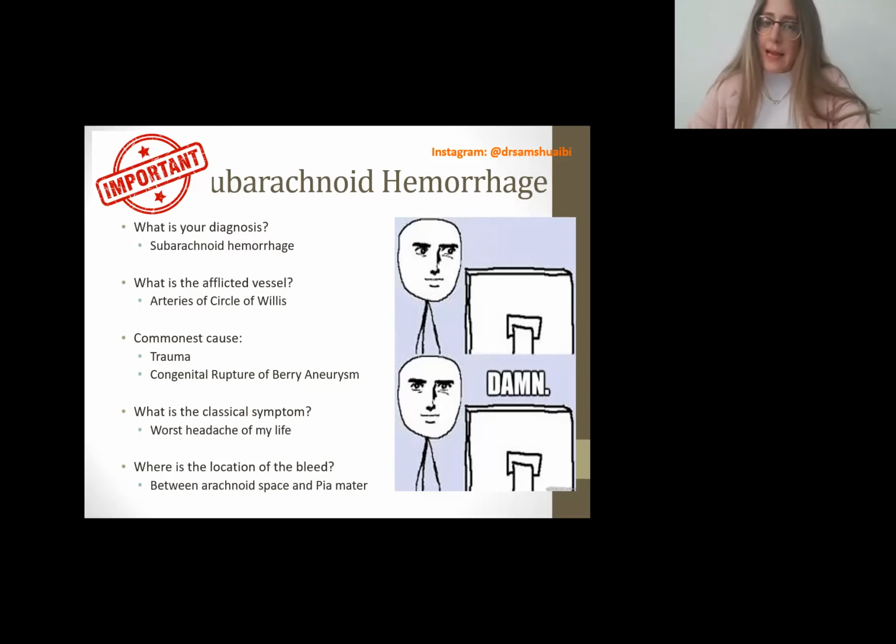Okay. What is the classical symptom? Let's say you're doing the Canadian exam or the USMLE, and you're reading through the 17-line USMLE Step 2 CK question stem, and you have no time, you have 1 minute, and then you see worst headache of her life, occipital headache, worst headache. And then they say attached is a CT image. And then you click it, it's final. This is subarachnoid hemorrhage.